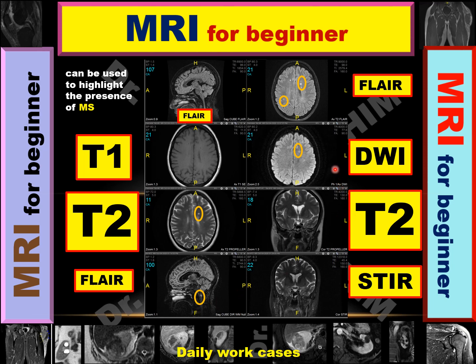In the diffusion weighted image, if the plaques appear bright, it represents activity. So these are the roles of the different sequences of the brain, which can help reach a diagnosis, detect the sensitivity to the number of abnormalities, and also the activity of the lesion.